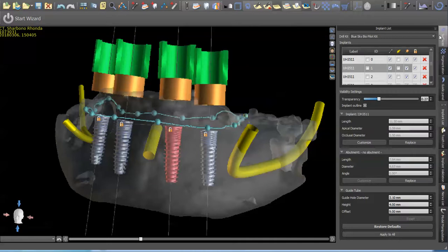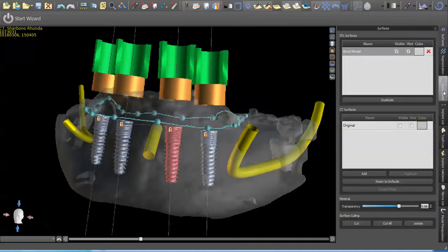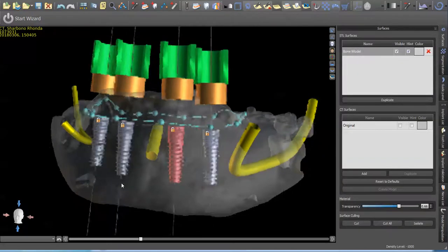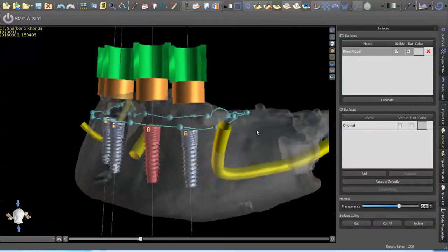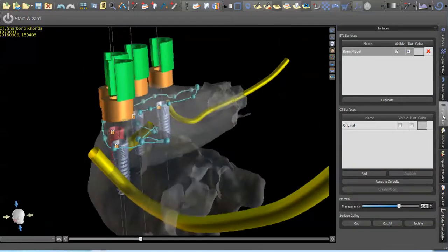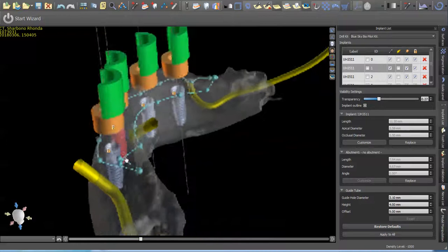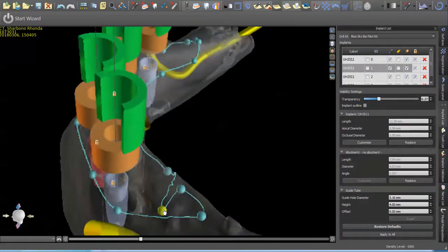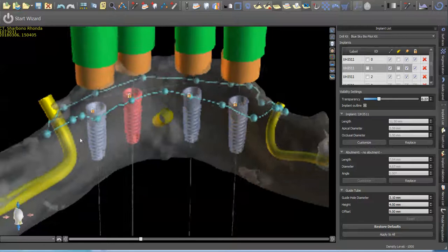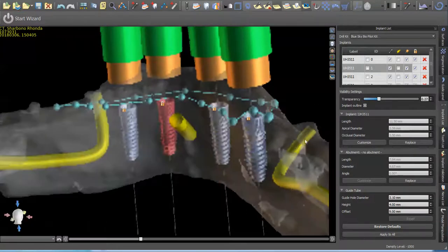And again, what I failed to tell you guys is we need to make a bone reduction guide and a pilot drill guide, because that's what I'm going to be doing for this case. All right, everything looks good here.